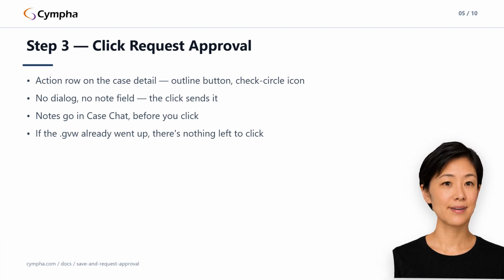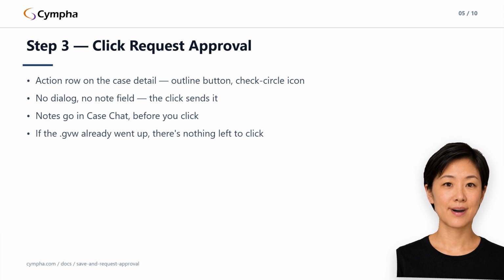And there's no note field. If you want to leave the doctor a written explanation of your design choices, send it via the case chat first, then click. The chat thread is preserved on the case for the customer to read.